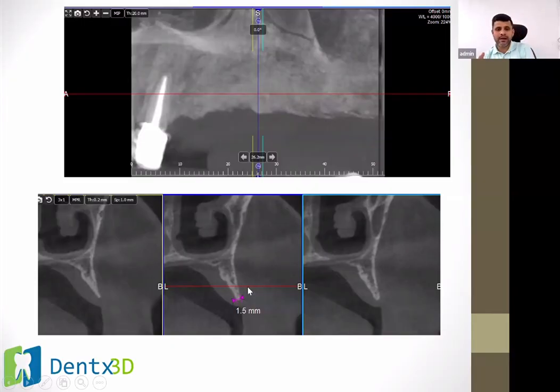Clinically, it will appear as a wide ridge. So a doctor will say that there is good height and good width. But only when you open it do you come to know that the ridge is very narrow. This can be seen firsthand on a CBCT scan, where we can plan for either grafting, or a split technique, or any other implant technique to avoid this problem.